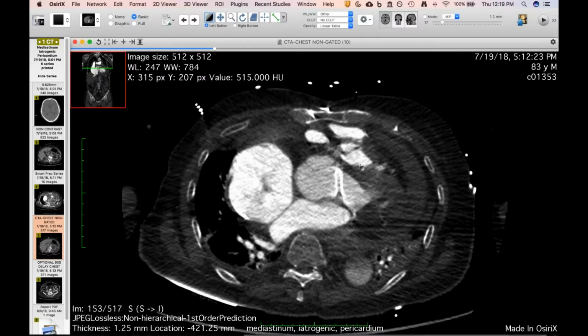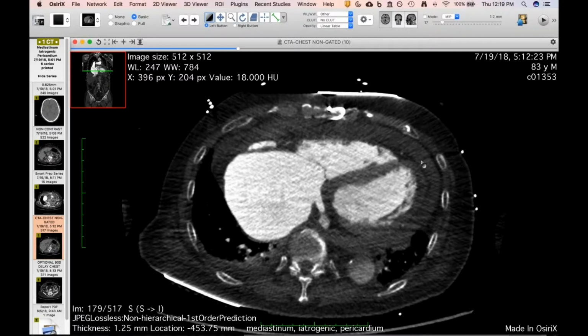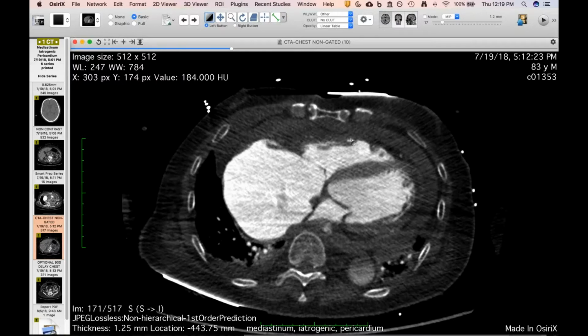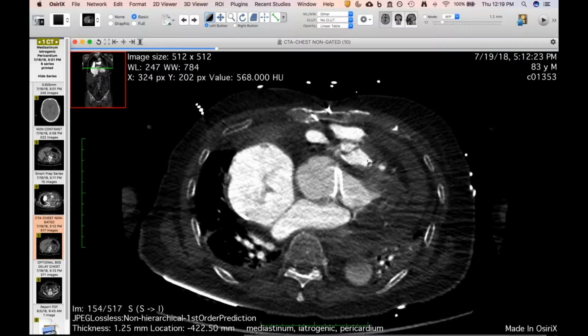He's got a small little fracture here, and I looked for some discontinuity of even the costal cartilage in this area. But the clinical team that resuscitated him said that his sternum just felt like a flail chest. They definitely broke a lot of his ribs there.